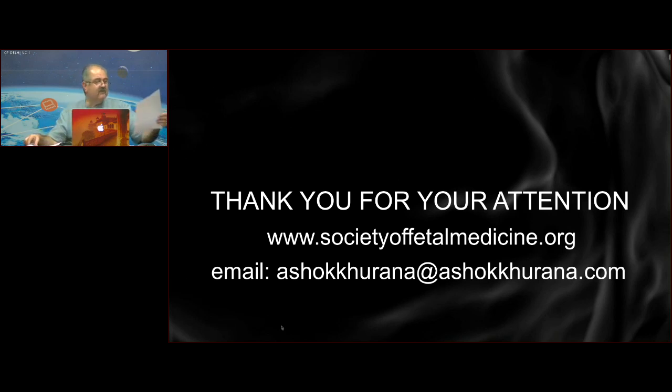We really have a charming number of questions, and I'll go through these. And there's a nice question here. What are the causes of persistent unilateral echogenic contracted kidney with loss of corticomedullary differentiation with small subcapsular cysts? Other kidneys absolutely normal, no associated abnormalities. I showed you an example of bilateral kidneys that were like this. Those were classically obstructive dysplastic kidneys, bilateral.